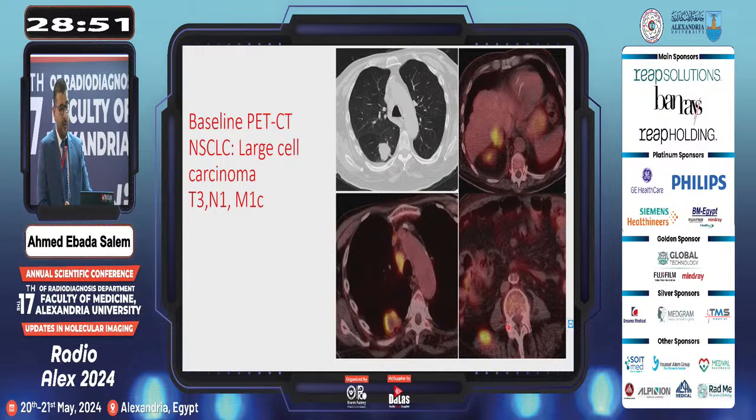This is a different patient who was diagnosed with large cell carcinoma. He was staged as T3N1, M1C. He had adrenal metastasis as well as muscle metastasis.